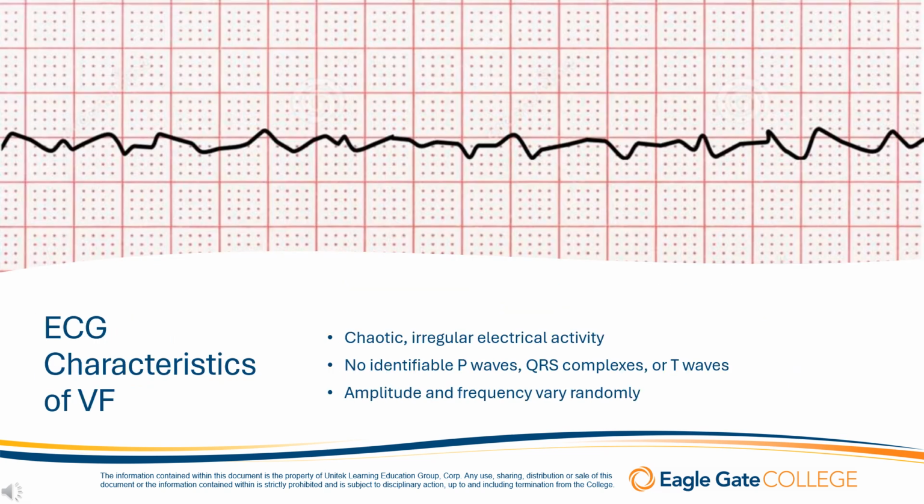Ventricular fibrillation, also known as VF or VFib, is one of the most critical rhythms to identify on an ECG because it requires immediate intervention to prevent patient death. The hallmark of VFib on an ECG is chaotic, disorganized electrical activity. Unlike normal rhythms, there is no coordinated electrical signal that leads to effective heartbeats. This chaos reflects the multiple erratic electrical impulses firing from different areas within the ventricles. This disorganization means the ventricles are quivering instead of contracting in a synchronized manner.